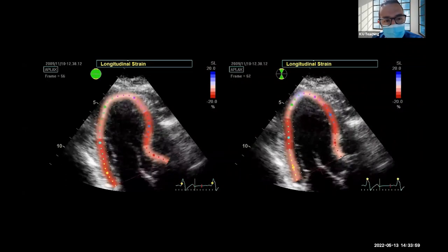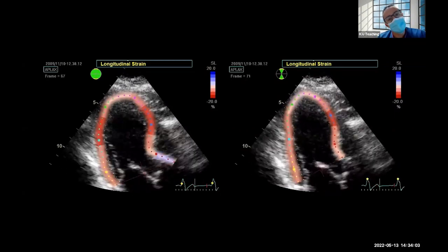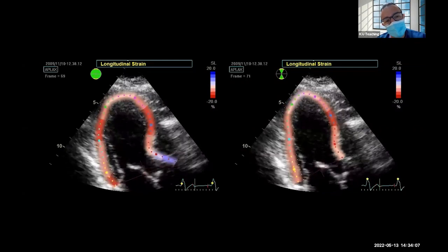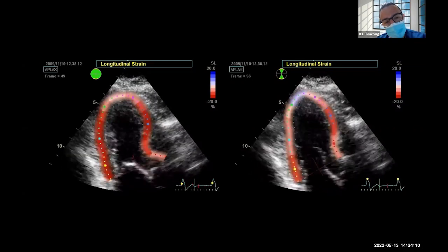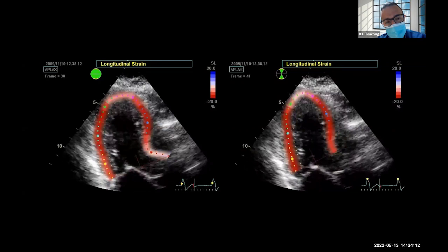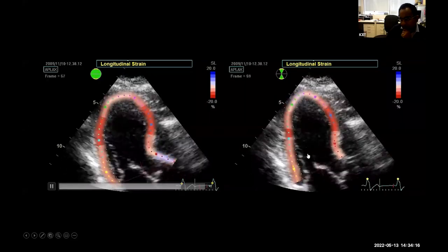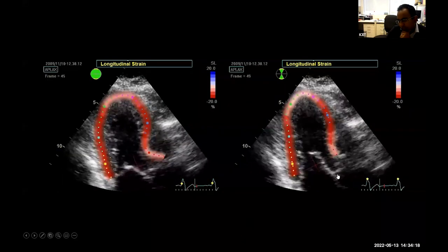Again, it's similar errors to the previous one. The tracking includes the left ventricular outflow tract and beyond into the aortic root. Exactly right, and you're 100%. So in panel A, actually I'll go to panel B. That's where normal in a 3-chamber view is.